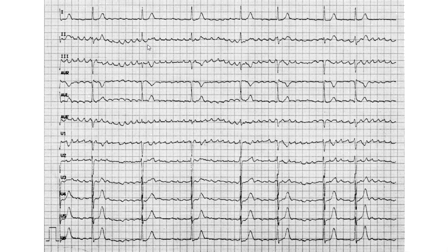Point 2, the P waves: is the rhythm sinus or non-sinus? Here, I don't see any P waves because I definitely see some sawtooth appearance, or at least what looks like sawtooth appearance. So point 2, we say non-sinus. Clearly, this is very clear that it's non-sinus. Point 3, heart rate: 1, 2, 3, 4, 5, 6, 7, 8, by 6, 48. Okay.